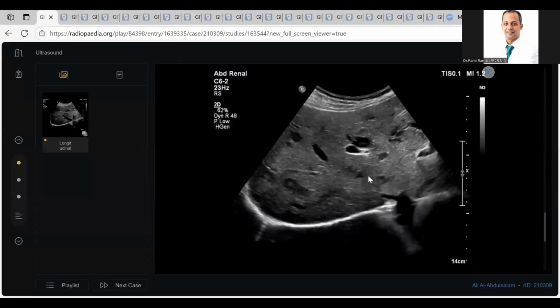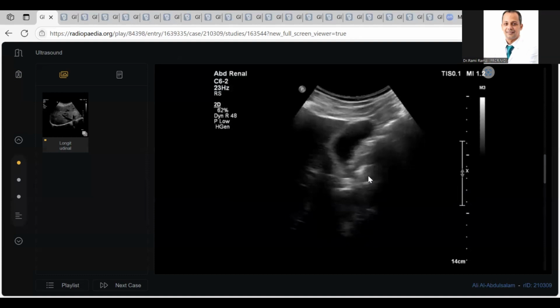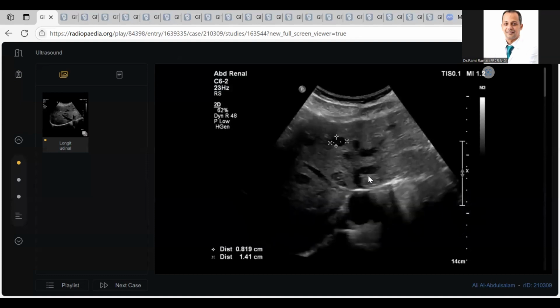The gallbladder seems unremarkable. I'm looking for the intrahepatic biliary channels. They are not seen dilated. Portal vein, hepatic vein, and IVC are unremarkable. What's the differential diagnosis? In these diffuse multiple focal lesions in the liver, these could represent metastasis, most likely diagnosis. I will look for the primary.